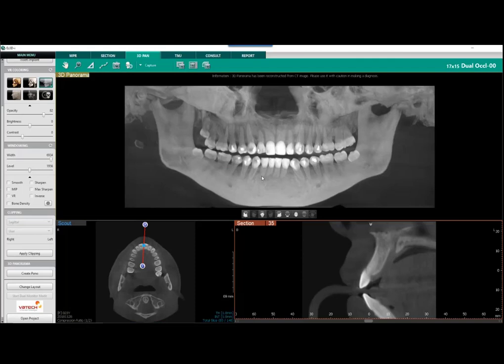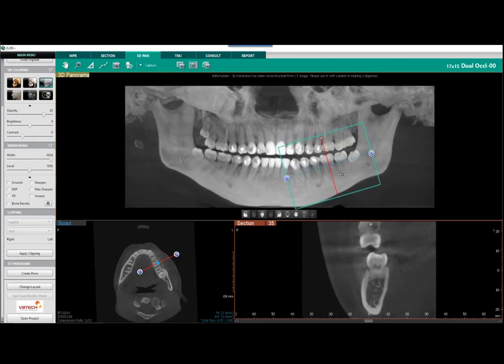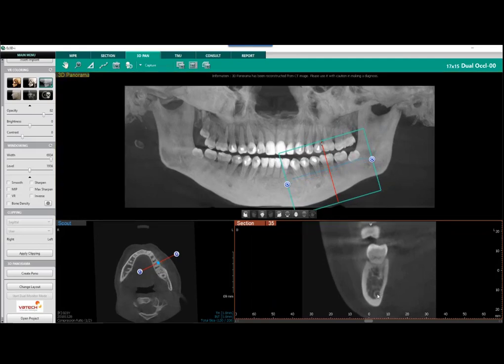I'm going to go ahead and hit my space bar here. And we're going to go down to our lower left over here. We're going to rotate our line here, and I'm going to drag this right to my intersection here. Let's talk about workflow of looking to trace the nerve. You come down here, we can see my inferior alveolar nerve right here.